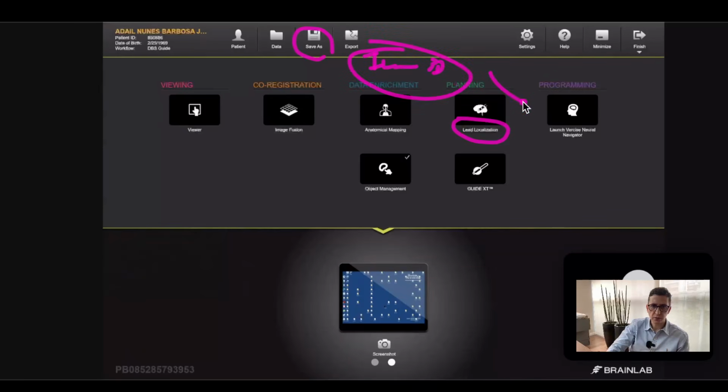And once you see your patient, when the patient is in your office, once you open up the programmer itself, over there will appear to you the nucleus that you have built here. In the next class, I'm going to jump directly to this screen, and then you're going to understand what I'm telling to you. But in this class, again, prepare the nucleus. Do like I did, slice in that way. That's the best way to slice the STN.